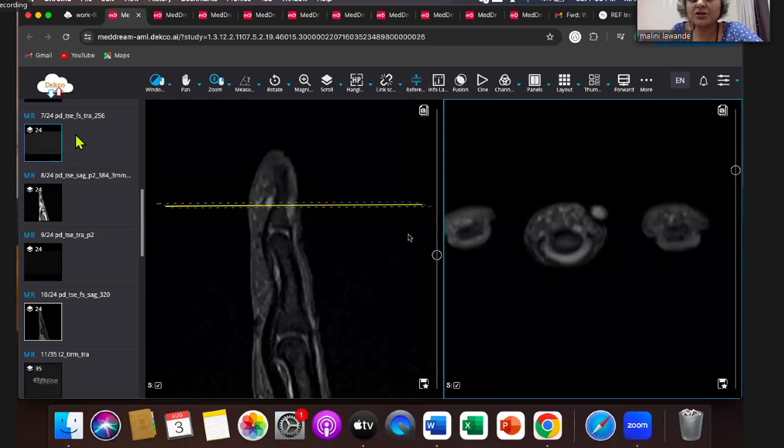This is not an inclusion cyst because it was very small. An inclusion cyst will be larger, usually following some kind of injury which has taken some of the squamous cells into the fingertip.